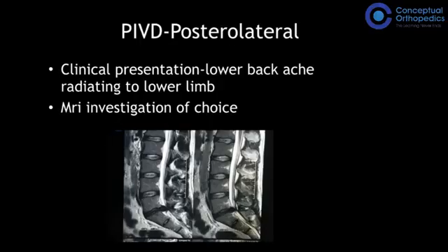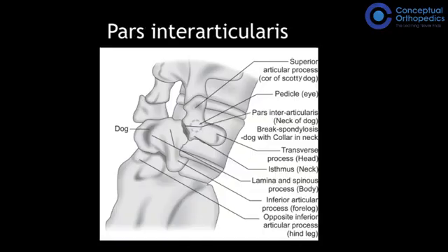When we look at the neuromuscular disorders, disc prolapse is one of the important things that you should remember, with back pain radiating to one of the limbs, called sciatica. So you can see the vertebra here, the disc, the grayish area vertebra, then the disc, the grayish area vertebra, and the disc, the blackish area which is prolapsed out, compressing the lower nerve roots.